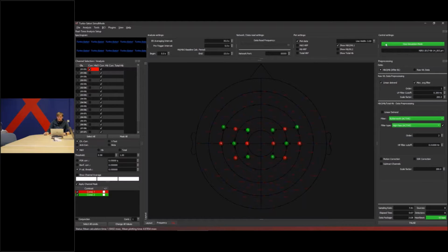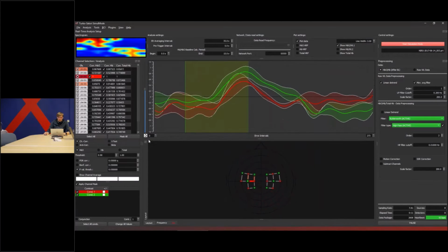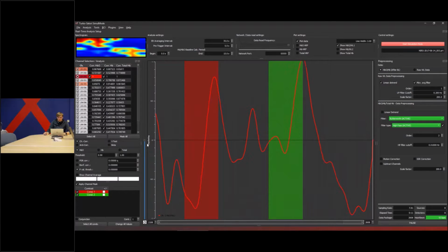Okay, let's look here at the top in the bar. We have different options here. In the analysis tab, we have basic options for the GLM, for the diagnostics, for SVM, and for channel subtraction. What we've seen till now is that the channels are presented here, and we see a specific pattern.